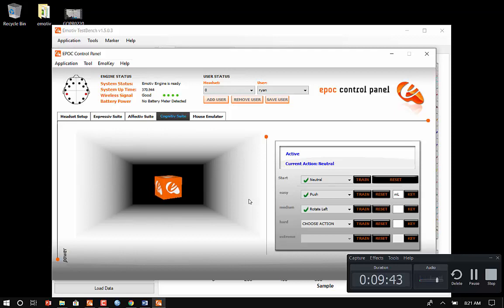Okay, so now look at the cube. Now push it away. Think about pushing. That's rotating, right? So whenever you move your head and kind of wiggle around or smile too much, see that it says signal is noisy? Okay, so now try to think about pushing. Why is it hard to do two different things? He was able to push it no problem before, but then he's able to rotate it no problem. So now that he has feedback, this is the same as a little eyeball sensor on his brain.